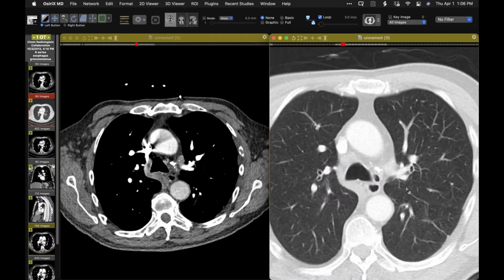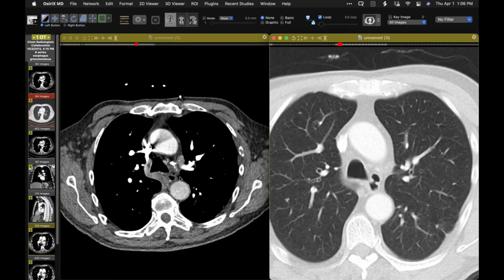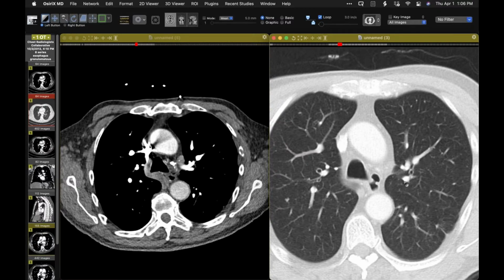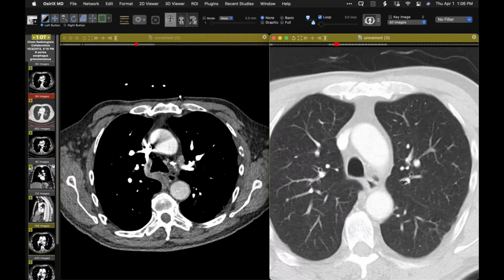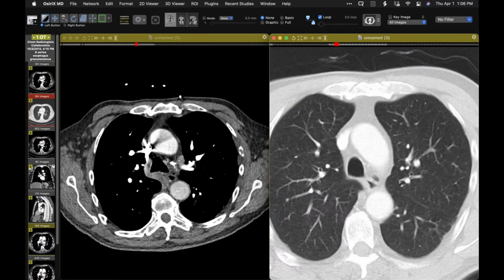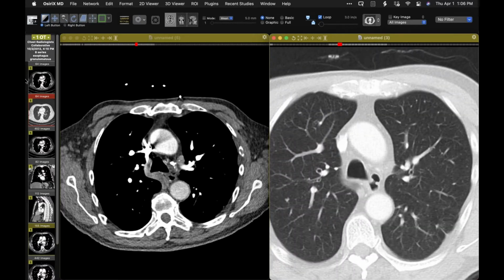There's the adjacent calcified node. So clearly some food has accumulated within this small traction diverticulum. So that's certainly a classic thing, traction diverticulum versus pulsion diverticulum. This isn't very big, but I think we can confidently make the diagnosis of a small traction diverticulum. Okay.